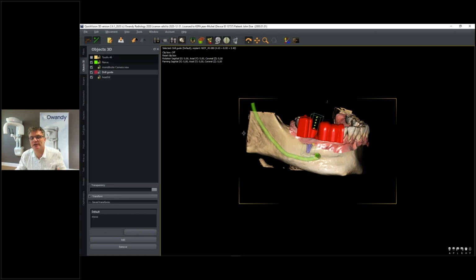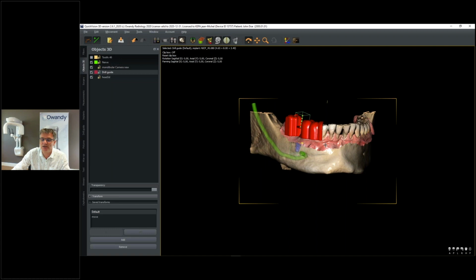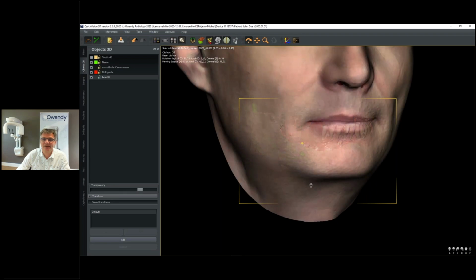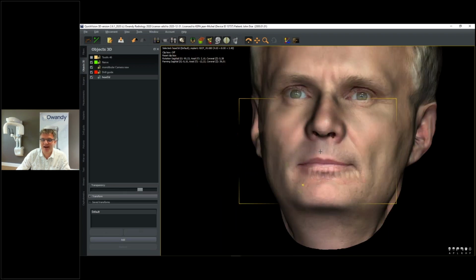And you see all these tools here, it's a quick way to explain to your patient what you do, and they will probably be impressed by all these necessary, modern technical tools, and for sure, go back to the head, to recover for sure the smile. Okay, maybe you may recognize me. It's me without glasses for sure. Okay, it's a real study on myself.